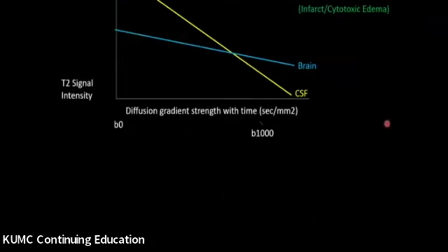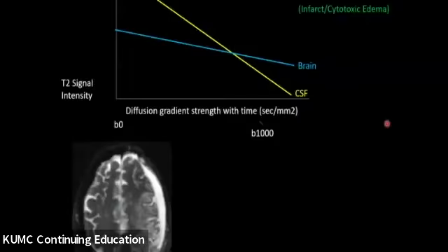So now moving on to the more complex concept, and that we see this commonly in the subacute stage of infarcts. So here we have a late subacute MCA territory infarct. Again, on the left, they've had their hemicraniectomy. And as expected in this state, where now we have more vasogenic type edema, gliosis, maybe some early encephalomalacia, it's very bright, as expected. So we're going to expect it to start off somewhere here, very bright.